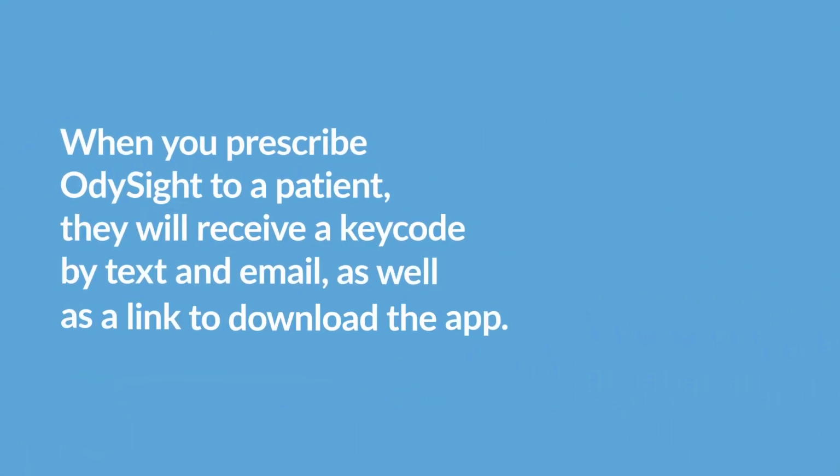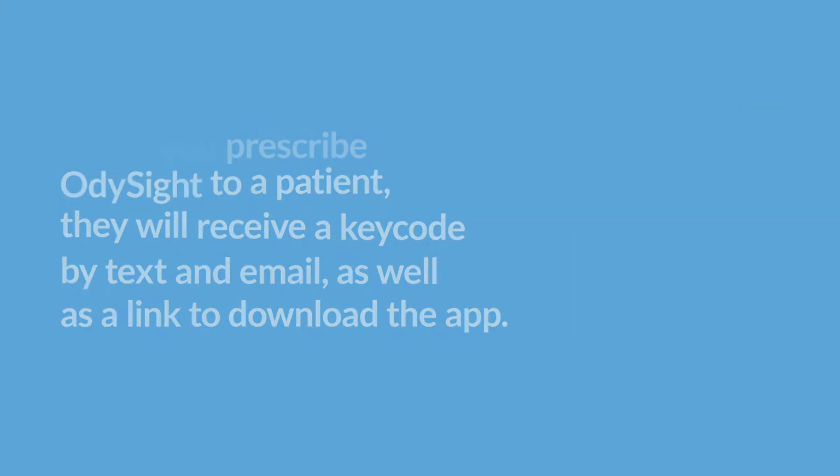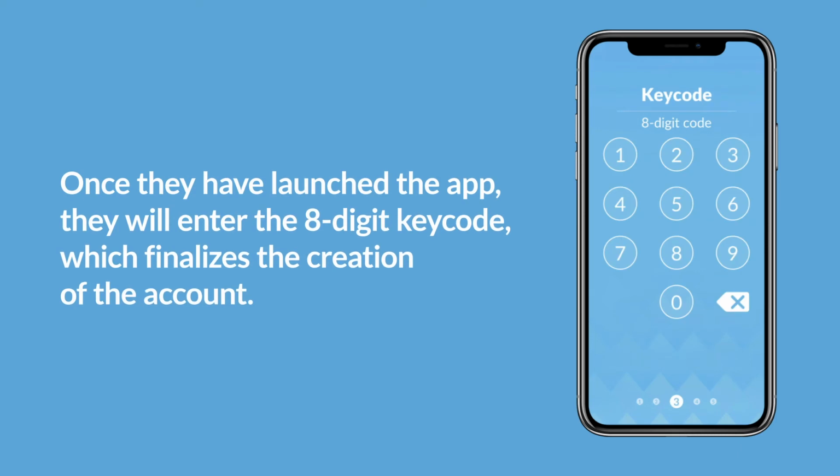When you prescribe OdySight to a patient, they will receive a key code by text and email, as well as a link to download the app. Once they have launched the app, they will enter the 8-digit key code, which finalizes the creation of the account.